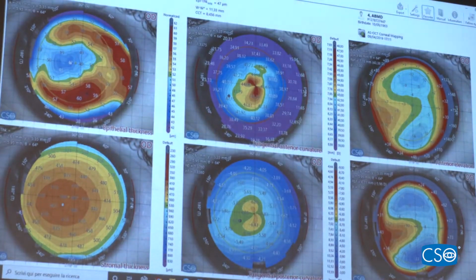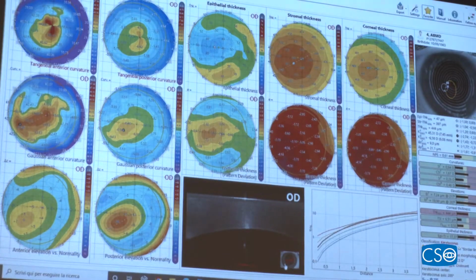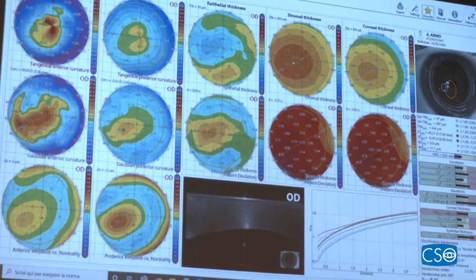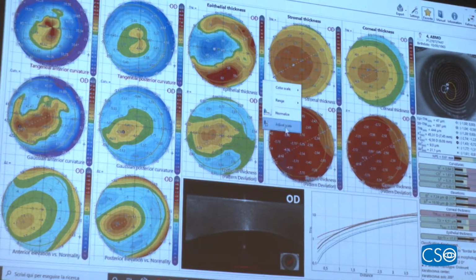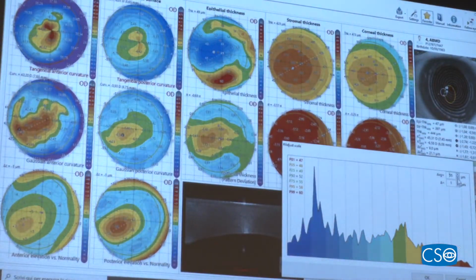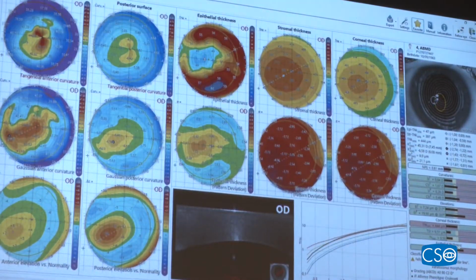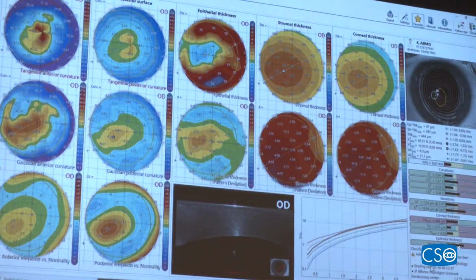Now we're going to go to our keratoconus display, and we're starting to get a little concerned here. We place the cursor, it doesn't look too bad, but this is scary when you have concordance on the front and back surface, and the epithelium doesn't look quite right. There looks like there could be a cone coincident, do you see that? There's something, and the keratoconus is classified here.